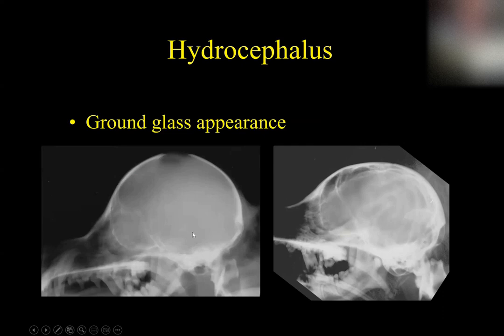That is a suggestion this dog might have hydrocephalus. The way I always thought about that is the ventricles get too big, too much fluid inside these ventricles, and they put pressure on the brain, which in turn in these young dogs puts pressure on the inside of the calvarium, and it will not allow these ridges to form. So it kind of smooths them all out. So one suggestion you can get with plain films for hydrocephalus is you do not see these convolutions inside the brain.